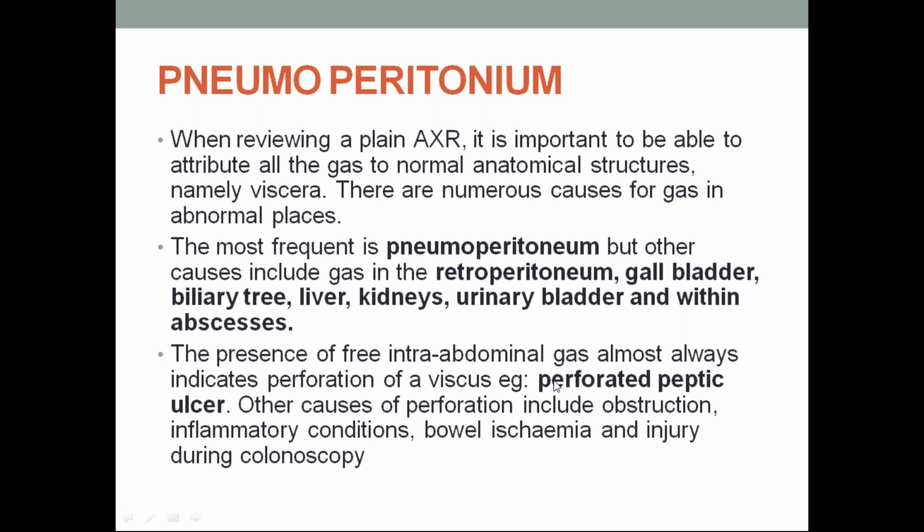Example, perforated peptic ulcer. This is the most common condition. Always you will find gas under the diaphragm. Other conditions causing perforation include obstruction, inflammatory conditions, bowel ischemia, and injury during colonoscopy. And during these procedures also you will find intra-abdominal gas.